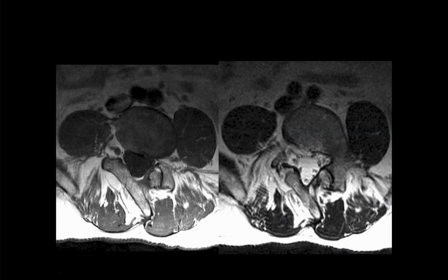So it looks like we have some deviation of that spinous process to the left. The defect there, in the pedicle or the lamina? Okay, so this is one cut. This is another cut. So you're talking about right in through here. Okay. But I think that's kind of cutting underneath the lamina. What do you think about the foramen on the right side here? It is definitely larger than the left side.